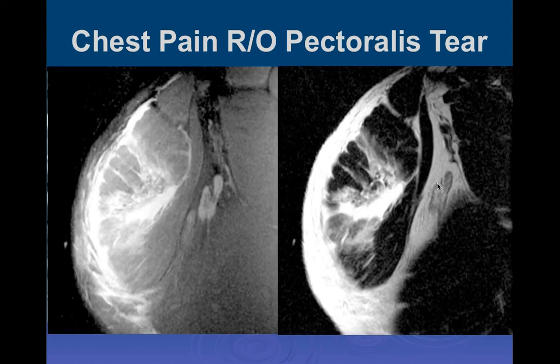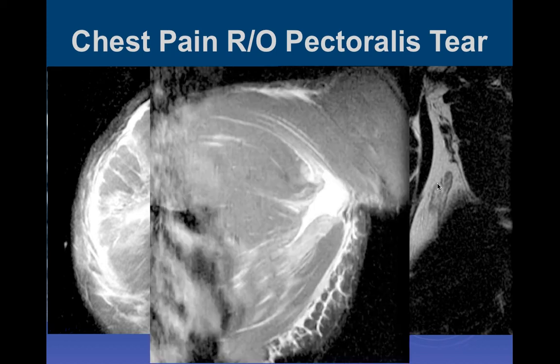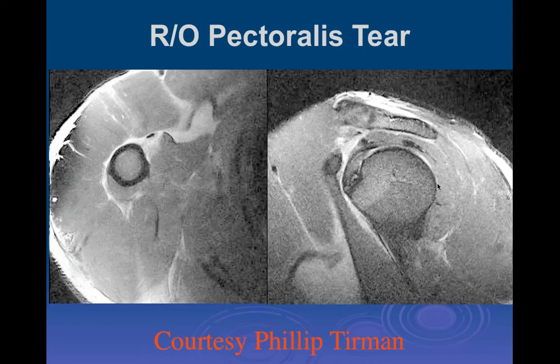Okay, and then here are just the sagittal images showing the tear within the muscle itself. So this is generally considered a non-surgical lesion, conservative treatment. Here's another patient. I'm sorry, Dr.